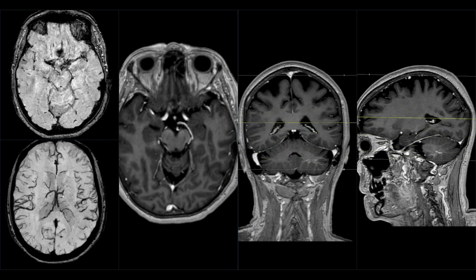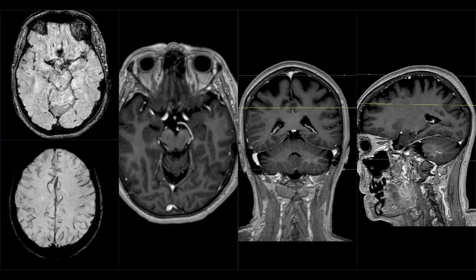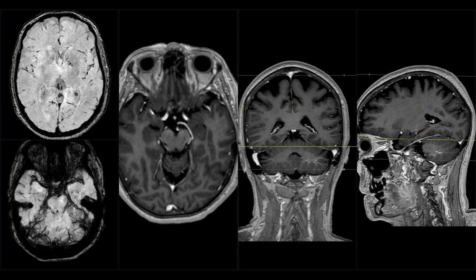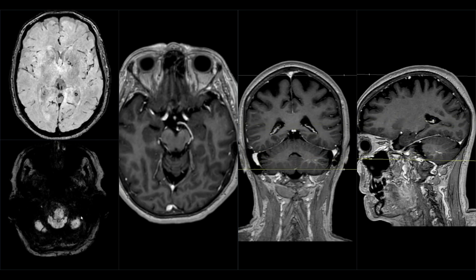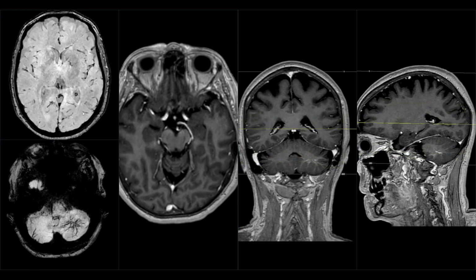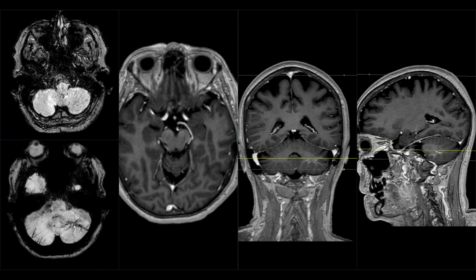It's basically the same sequence, but the slices are thicker, so what you see on the same image is more of the vessels. So those small tiny vessels that you see are venous cortical veins. You can see also arteries, and you can very well see the DVA that is showing no sign of hemorrhage. This is very important, that we have no signs of hemorrhage in this area. So the developmental venous anomaly has, as usual, not caused any hemorrhage.